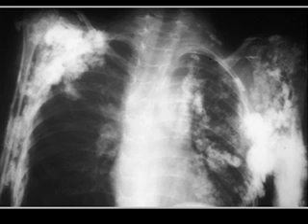There are thick, sheet-like calcifications that are associated not only with the shoulders and arms, but over the thorax as well.